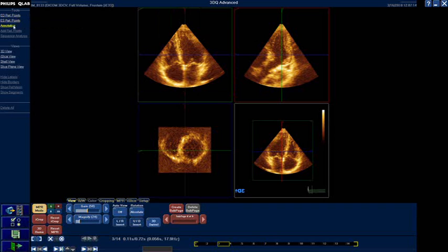The steps of the software are displayed here. The first step is known as end-diastolic reference points. So the software will give you some points to put at the end-diastolic frame. That means we have to choose the end-diastolic frame first. Because this acquisition is usually guided by the ECG, usually the first frame or the last frame will be the end-diastolic volume empirically. Because this is an ECG-gated multiple beat acquisition.